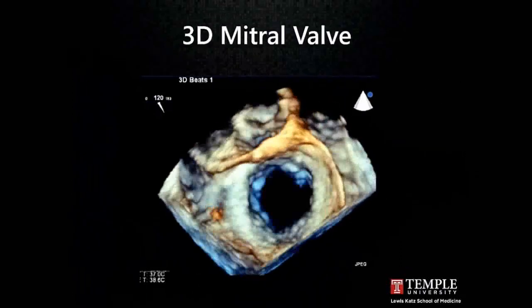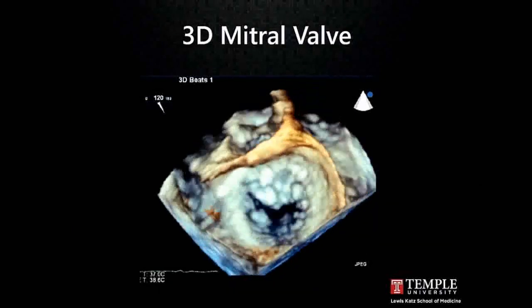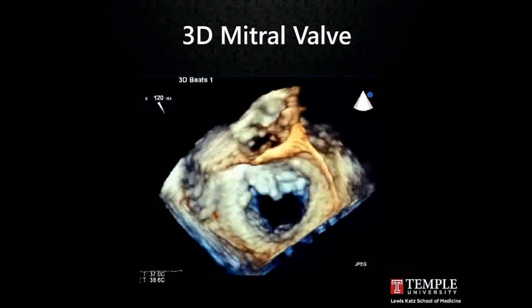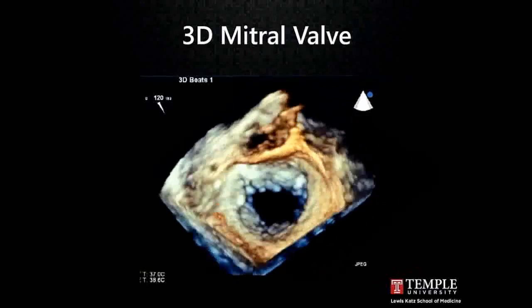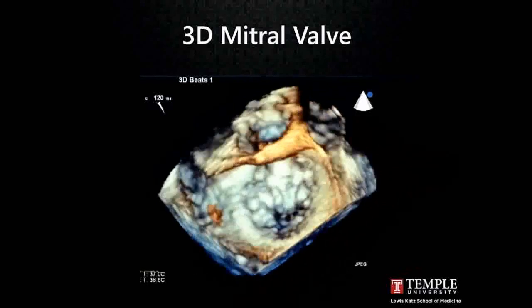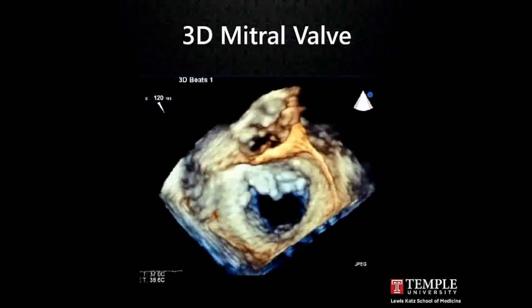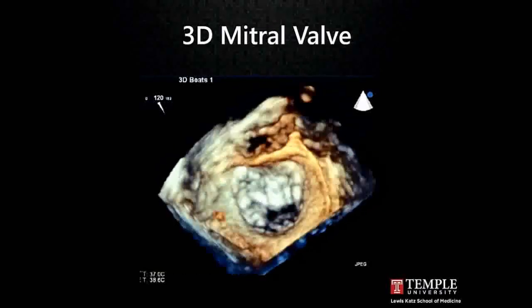3D mitral valve, this is considered part of the normal exam. This is part of the normal TEE. And so you need to appreciate the 3D anatomy of the mitral valve, the structures that surround the mitral valve and how they appear on 3D, as well as the scallops, the commissures, the papillary muscles, the chordal structures, as well as any pathologies, obviously. But in this example, just remember that you shouldn't be surprised to see a 3D image show up on your exam.